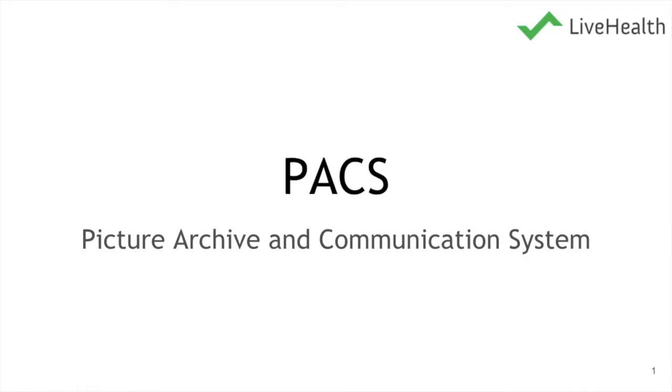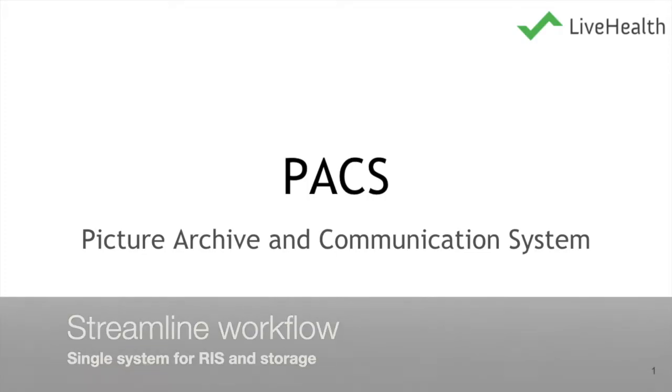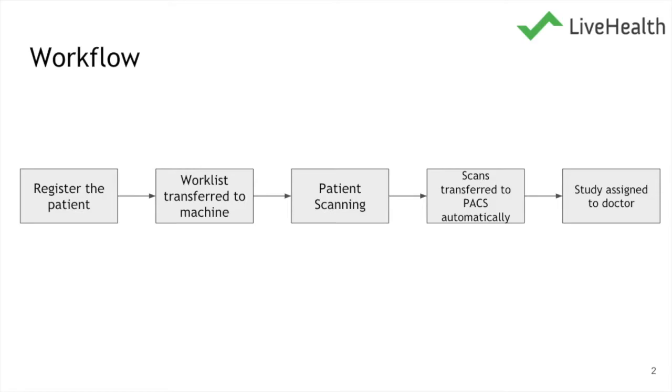So we'll see how you can use the PACS, or picture archival and communication systems, in LiveHealth. This allows you to streamline your radiology workflow so that you can combine your RIS and storage systems together, and you can store all your scans in the cloud automatically. It also allows automatic data transfer from your RIS to the machines.